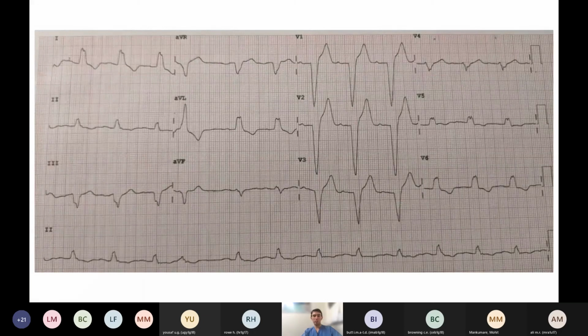And that's because patients had a left bundle branch block and they just didn't have an ECG beforehand, so we consider it to be new, and the chest pain was maybe not. So left bundle branch block is a difficult area. If you have a left bundle branch block on ECG and a patient's got chest pain, the thing to be worried about is, do they look like they're having an MI? Is the history and everything else consistent?